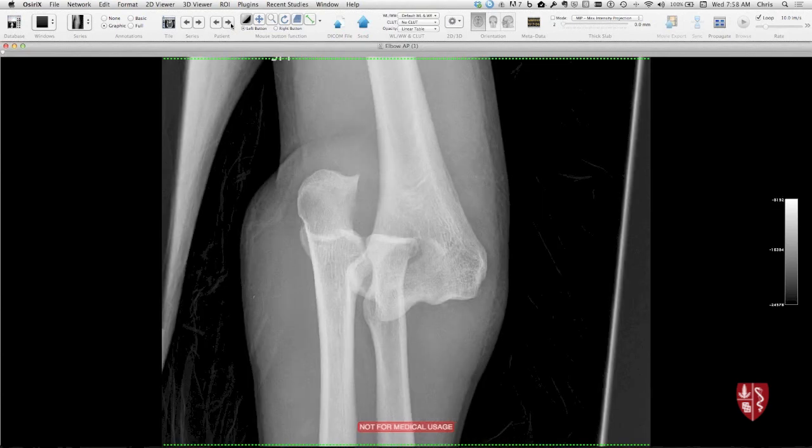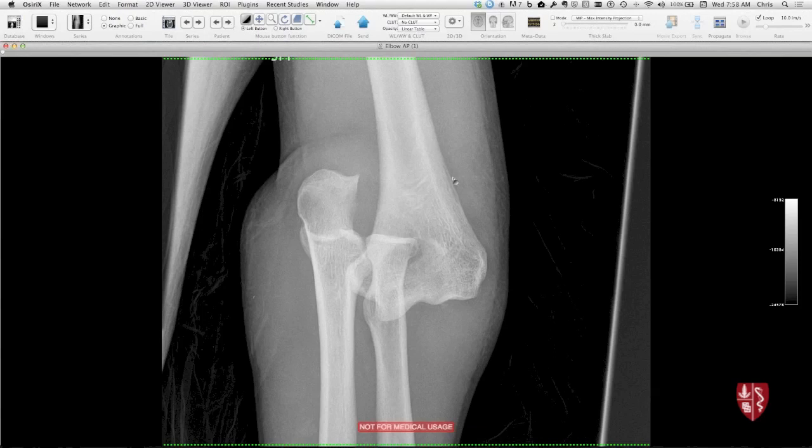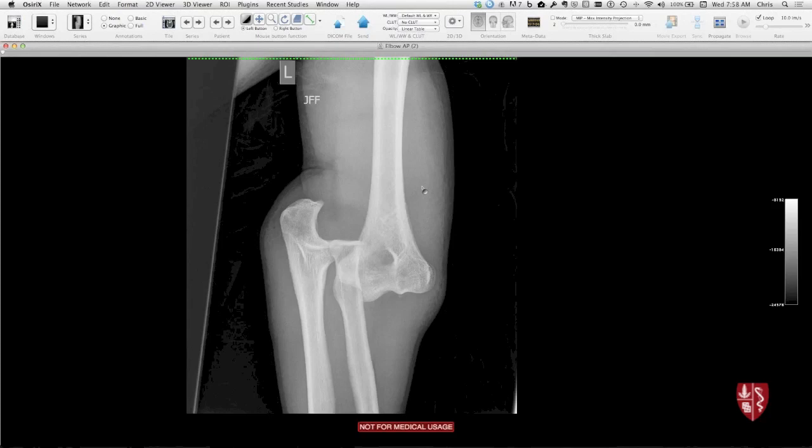What about this one? Patient fell on an extended arm and comes in with a little bit of a deformity. Both bones dislocated, right? They're both oblique views, really, but the bones actually look intact. Here's distal humerus, the region of the trochlea, capitellum, epicondyle, and so the radius is overlapping. Ulna is also overlapping. Most often these elbow dislocations are posterior of the forearm bones, and it's not uncommon for them to have pretty limited fractures. If you do shear something off, it's often the coronoid process of the ulna that's kind of the last thing that keeps it from dislocating.